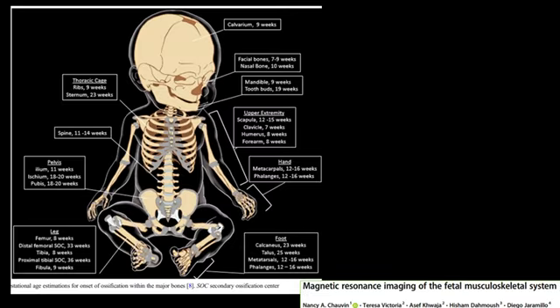This picture serves as a visual guide for us to help in identifying the expected ossification centers that we commonly see in the fetus. Our next question will naturally be, will there be any variability in the appearances of this ossification center? The standard error of appearance of ossification center is estimated to be approximately plus or minus 1 week. This variability increases with gestation. That is, it is less in a fetus of around 12 weeks of gestation than in a fetus of around 23 weeks of gestation.